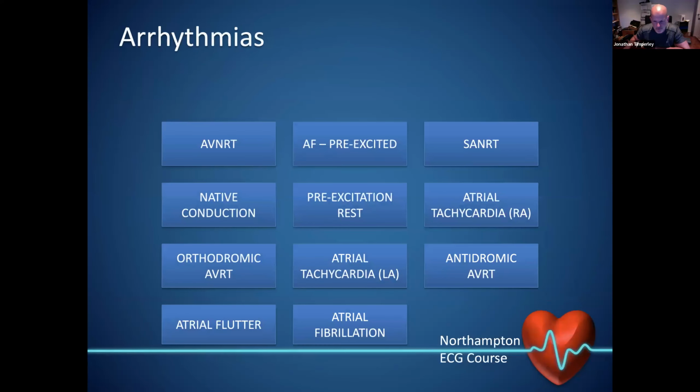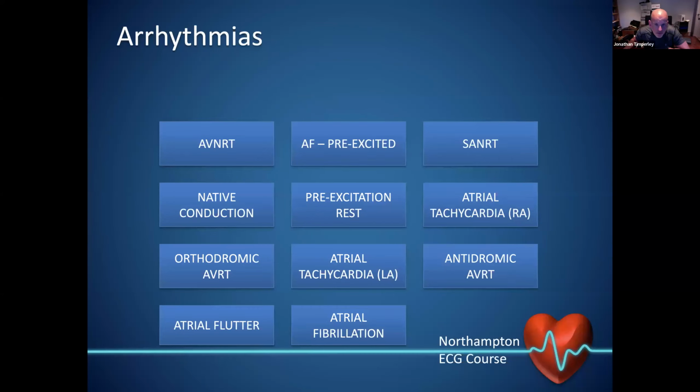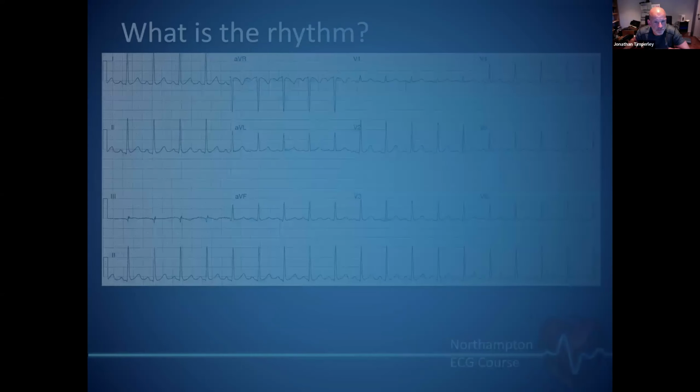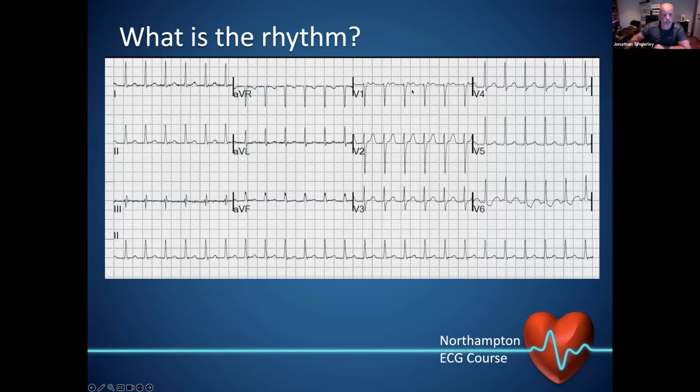So that was just a slide that gives me the option, if I need to, to go through any of the other ones that we've seen. And the rest, I'm just going back through, are just examples. These are some real life 12-lead ECGs. This is part of my ECG course, so hence asking them what they are.